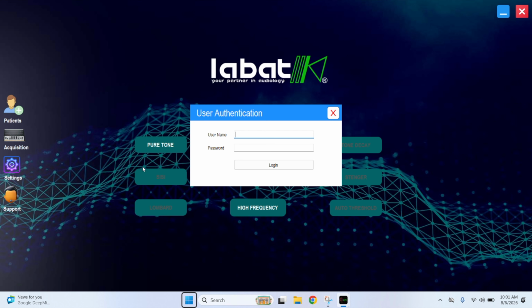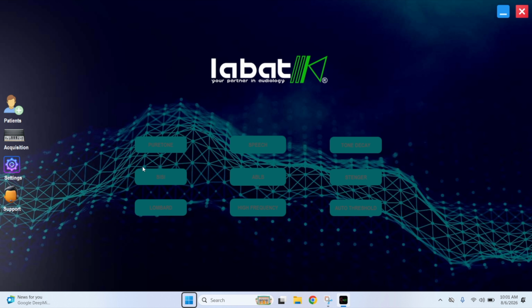This video demonstrates how to perform Pure Tone Audiometry, Speech Audiometry, and the Tone Decay Test using the Labat AudioSoft Platform. To access the software, enter your user ID and password, then click Login. If you require AudioSoft login credentials, please contact the Labat support team.